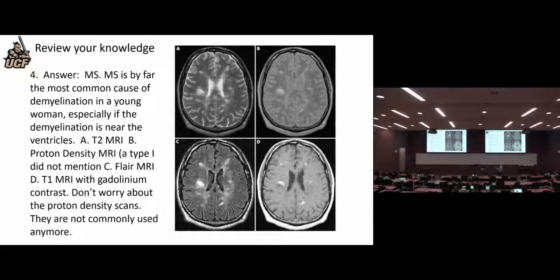You see this, you see this, you see this. But look, here's something here, and you don't see that at all. Or actually, it looks a little dark here. And also, this is much bigger than that. And this one, you see a little something here, but you don't see this long thing. So what does that mean? This had contrast, and this doesn't have contrast.